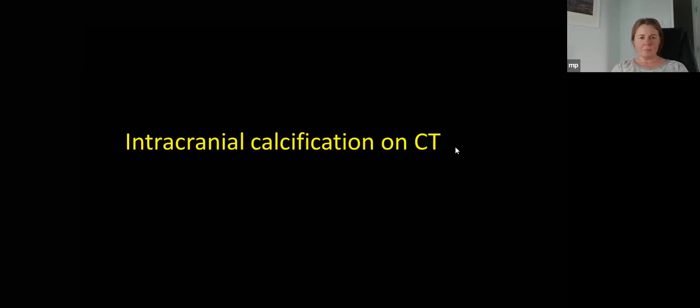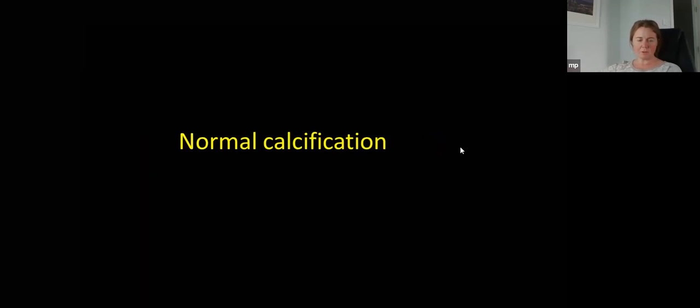So let's move on to intracranial calcification. If you've got any questions on hydrocephalus, maybe we can ask them just at the end. So we'll spend the next 15 minutes talking about calcifications, and we'll start by talking about normal calcification on CT.